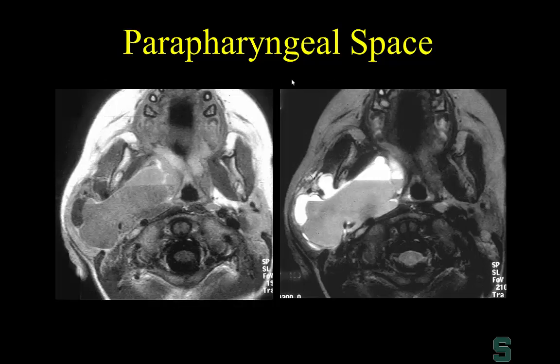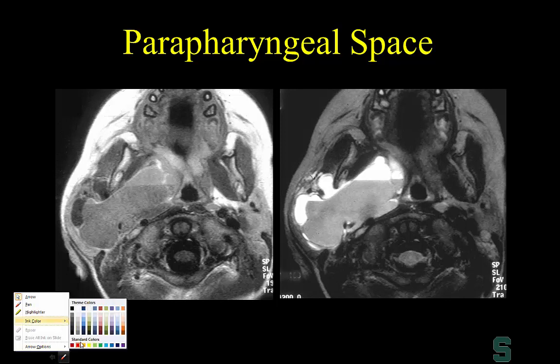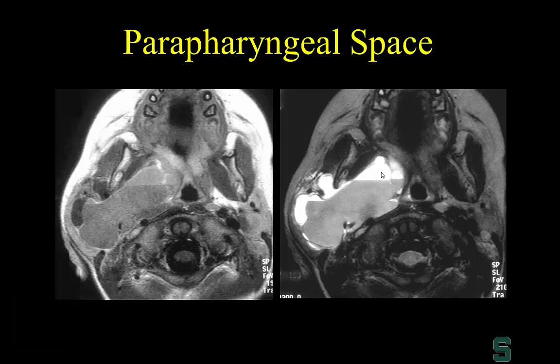Another example here, this is another pathology involving the parapharyngeal space. And again, I want to emphasize that in this case, the pathology is not important. I don't know if anyone can guess. This is a benign lesion that's cystic and has a fluid level. Anybody want to take a guess? A benign lesion? Lymphangioma, yeah, exactly. Lymphatic malformation, cystic hygroma, exactly right.